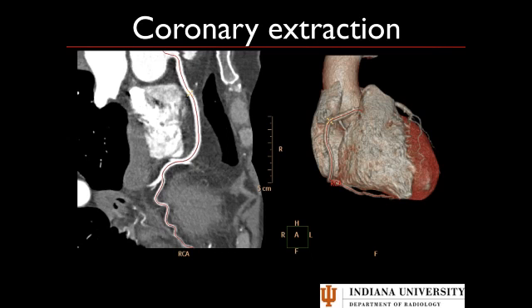What I showed you before, the manual process will always work regardless of the disease that's there if the vessel is occluded. But the techs nowadays most of the time are using these automated tools, and they'll just do some cleanup or correction if the center line gets off just a little bit.